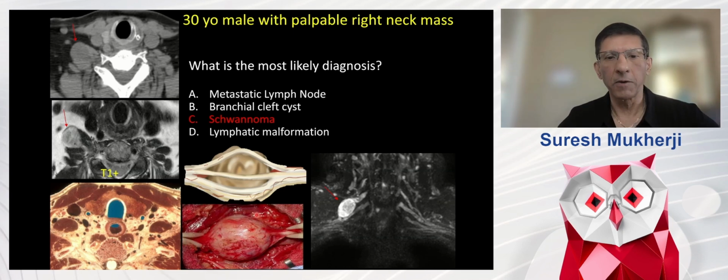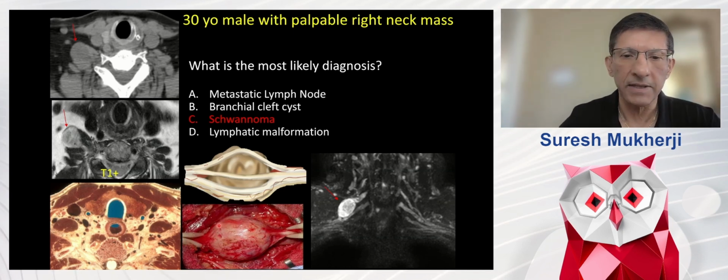So remember, schwannomas arise from the Schwann cells. They don't arise from the neurofibrils, but the Schwann cells. So essentially, they are eccentric, as we see here. It can sort of splay the various nerves. And the surgeons can go in and literally just pluck this out. And this is an example of a STIR sequence a little bit more elegantly demonstrating the schwannoma that's arising from these nerve roots.